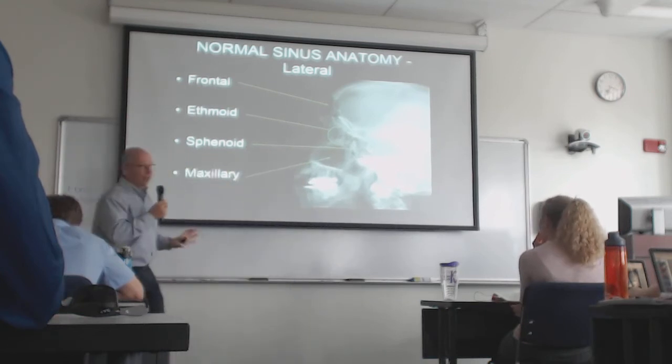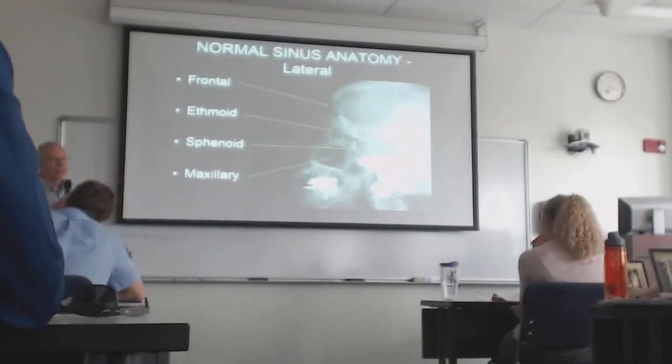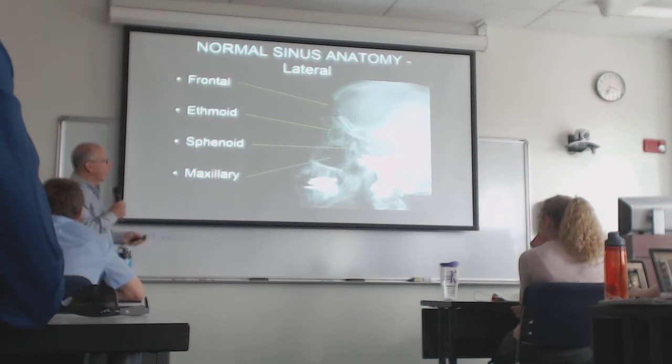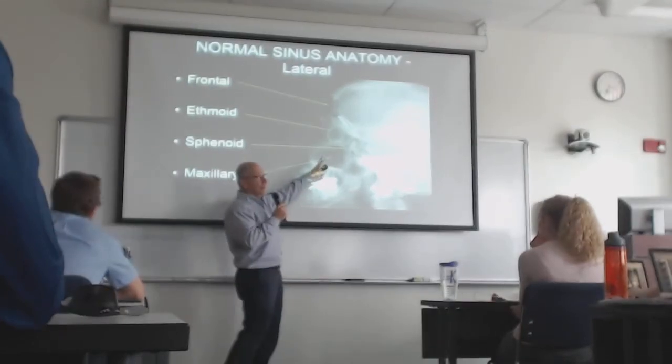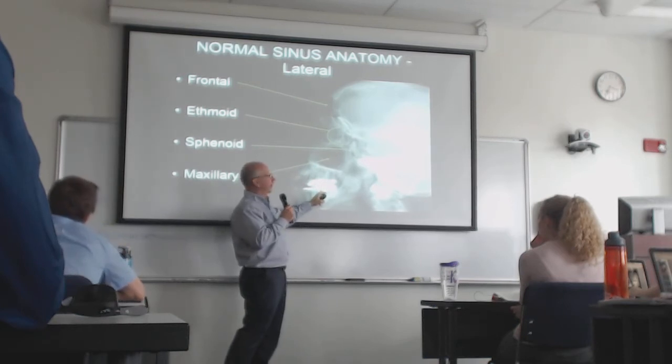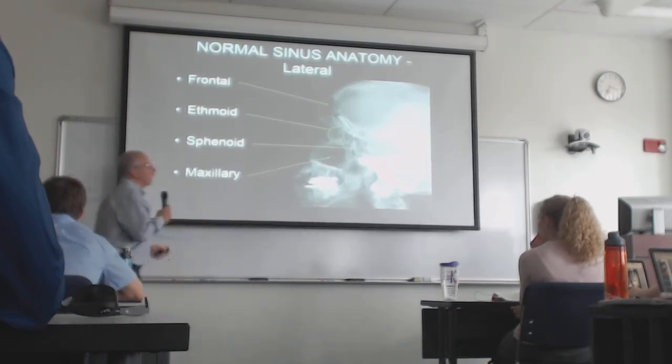Again, some of these are variably aerated, and like a lot of things in radiology, sometimes harder to see what isn't there. If the sinus is filled with fluid, you might just forget that it was there and call it normal, but you got to remember that there should be something air-filled there. So we all understand, right? We understand why the air is dark. We're all good with that, right? Why the fillings are metallic, right? Okay.